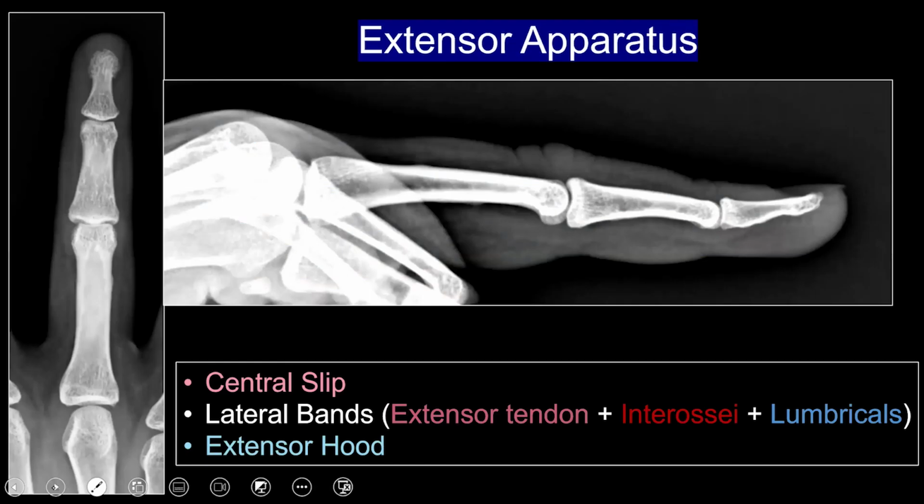So now let's come to the bony and soft tissue anatomy of the fingers, particularly at the metacarpophalangeal joint and the interphalangeal joint. If you look at the lateral radiograph, you have the metacarpophalangeal joint. Of course, before I go into the details, I would like to tell everyone, whenever you have a patient with finger injuries, you must do an AP view supplemented by a true lateral view. Don't do oblique views, because most of the time oblique views are going to overlook minor fragment injuries or dislocation and subluxation. This is a very, very important take-home message from my talk for those involved in conventional radiography. So let's come back to the anatomy.